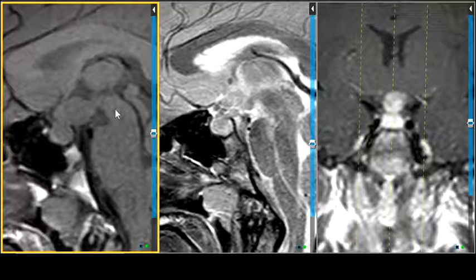Had it been an adult, you might include things like neurosarcoid, although that can occur in any age range. Metastasis to the suprasellar region, especially breast and lung, by far are big. And then when you have stalk involvement, there's some really weird things like pituicytoma and not so weird things like lymphocytic hypophysitis, but that's more of an inflammatory, infiltrative, immune-mediated process. So this is a mass as opposed to a non-mass-like enlargement of the stalk region.